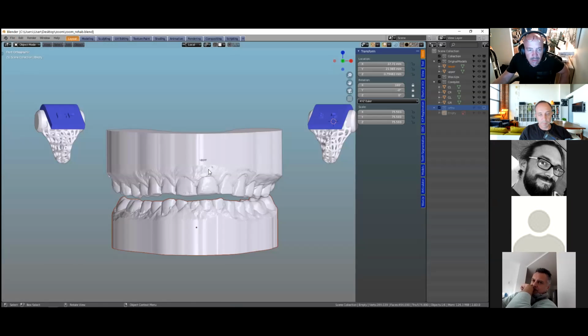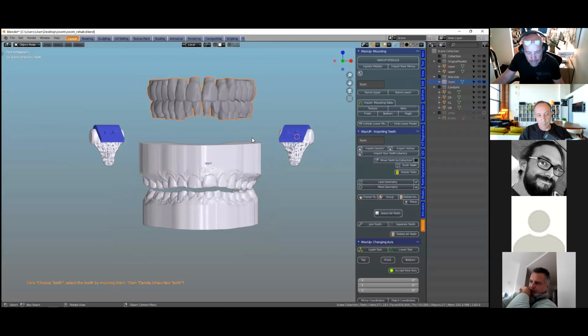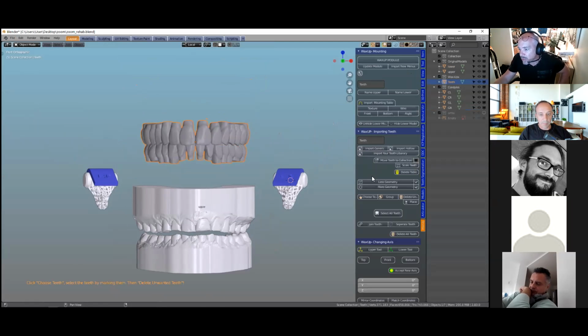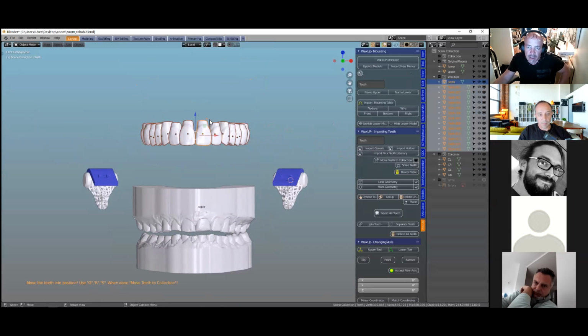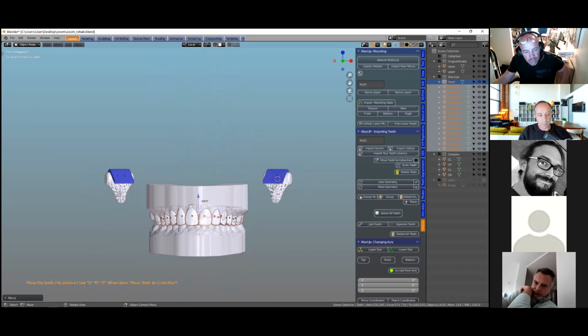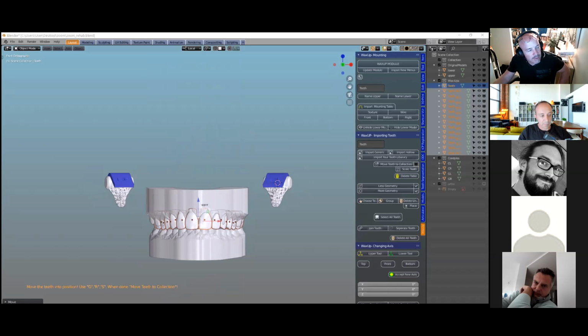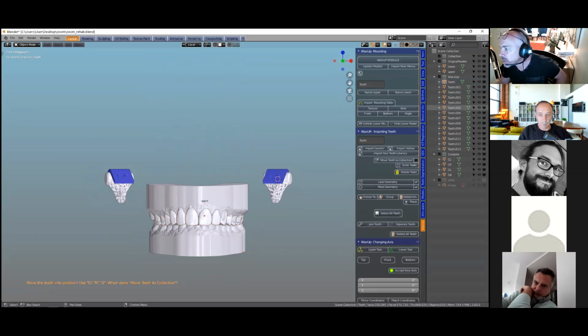All right, so I'll bring that big job in again, and we will import generic teeth. I will just select the teeth that I want to use, brush that across, delete unwanted, and then bring this down. In addition to all of this, we've got an orthodontic wire template. Actually, where have I got this? Here, I've got it here.